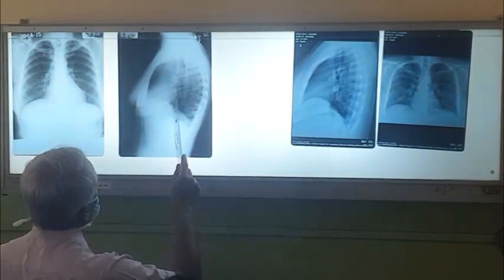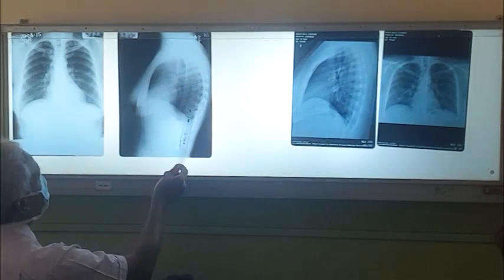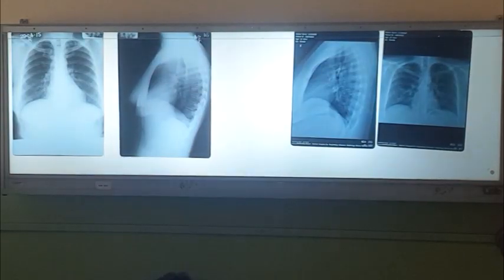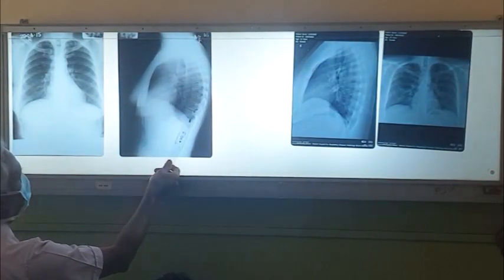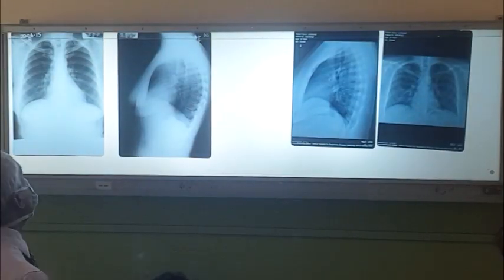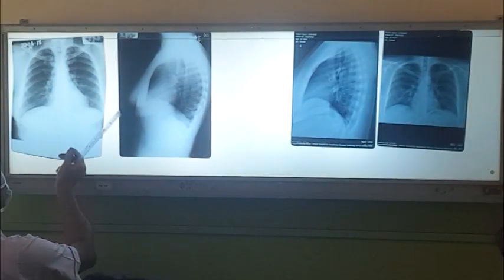If this has disappeared and this darkness is there, you will think of something in the anterior segments of the upper lobe or the mediastinum, right? If this darkness is there and everything here is whitish, there is something wrong in the basal, left or right. So these are the normal appearances of a chest X-ray. Then I will go through various abnormalities. So just remember the normal appearance.